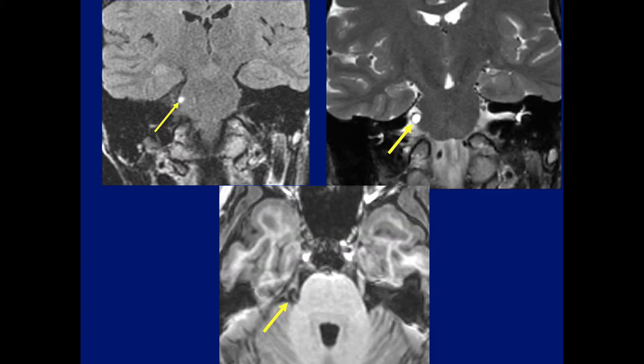This was a very unusual case. I remember this case from the past, but there's nothing listed now in EPIC. But this is, again, a tiny lesion, look at the abnormal signal in the FLAIR. On the T2, it has a cystic center, and also on the T1, we see it has a cystic appearance. This was a tiny cystic schwannoma. I don't know if it was operated or not, but that's the diagnosis the patient was carrying.